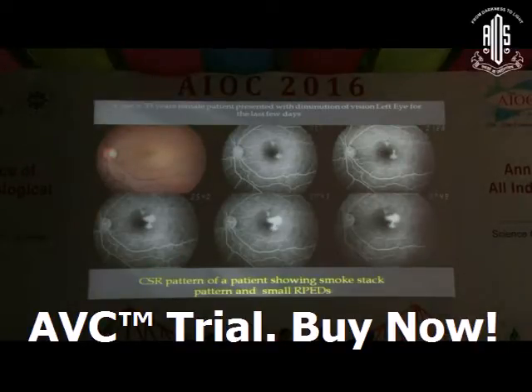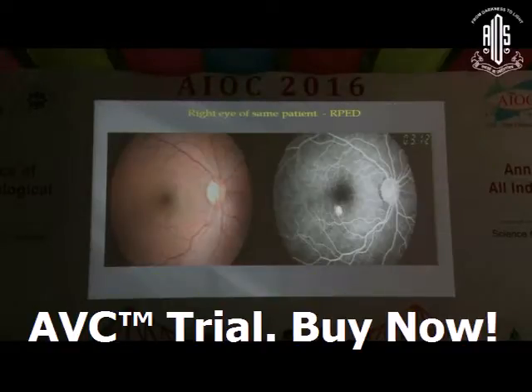Case 3, a 33-year-old female presented with diminution of vision in the left eye for the last few days. FFA was done. The CSR pattern of the patient again is of a typical smokestack, though at the root from where the first leak appeared, there is a small PED also. This is the right eye of the patient. It also shows a small PED.